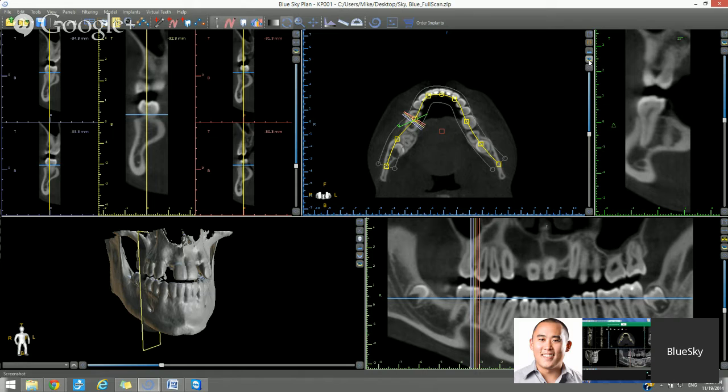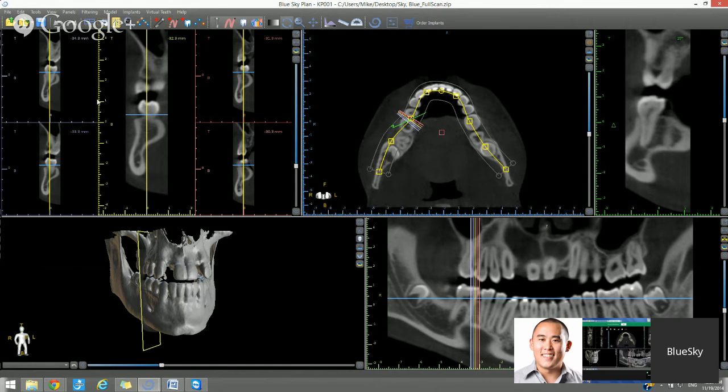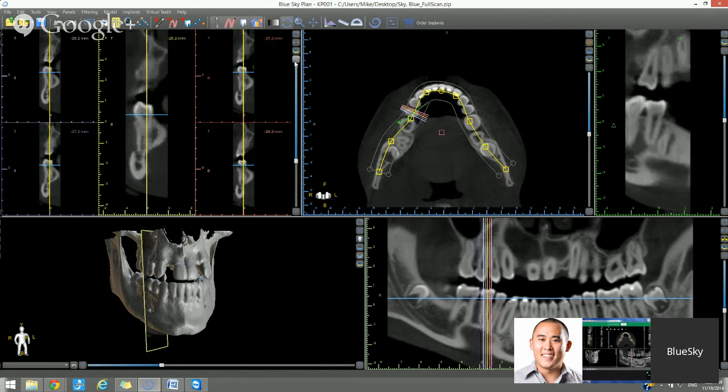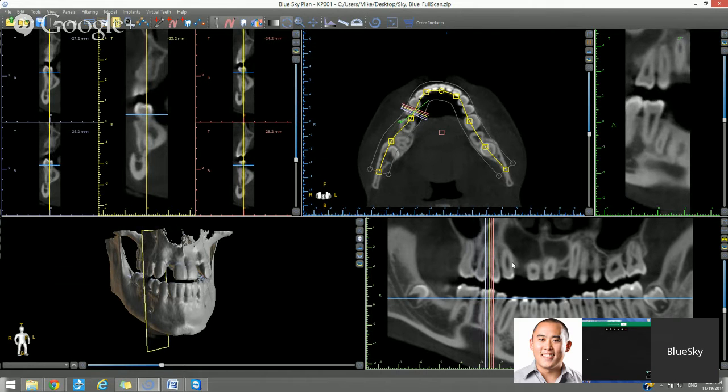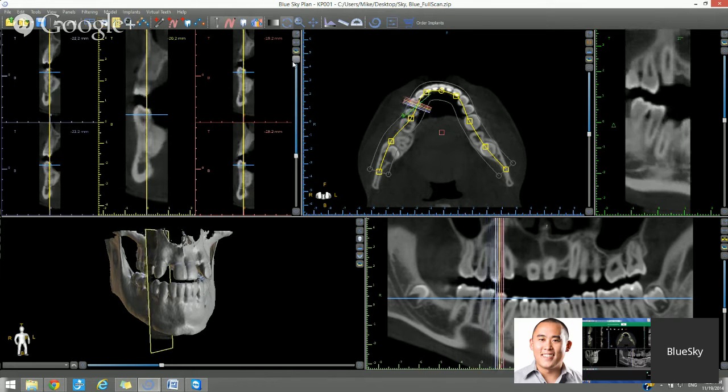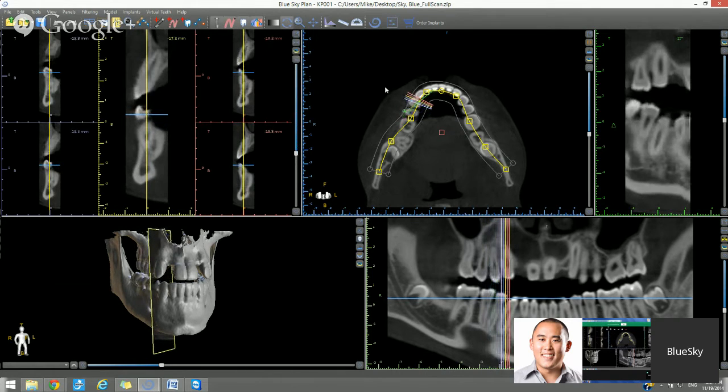And you can also take a screenshot of the view and add it to your basket. Our cross-sections view on the top left, we mentioned, is vertical slices. As we go through the slider, we can watch how the multicolor lines in the axial view and in the panoramic view are moving. That's showing you the location of the 5 slices that we're viewing. The leftmost colorful line corresponds to the top left image, the rightmost to the bottom right, and the ones in between correspond to the ones in between.